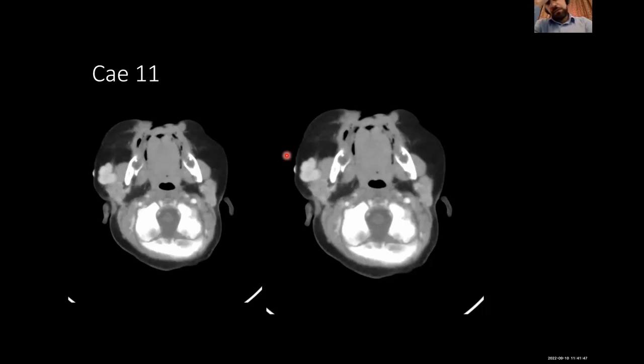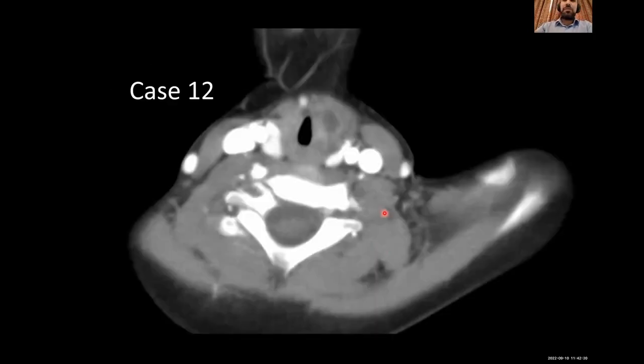Okay. Next case. Not typical for meningioma. Meningioma has a tram track appearance around the nerve. Okay, great. Thank you. This is hemangioma, and I have no words. You should not say any other things except that. Okay, infantile hemangioma.